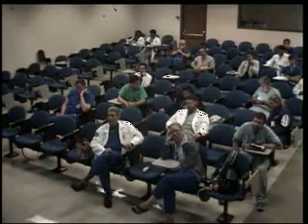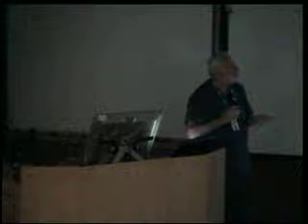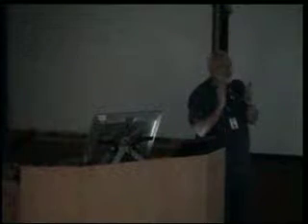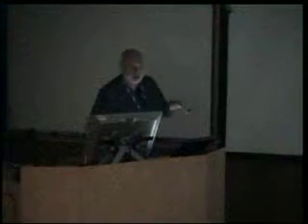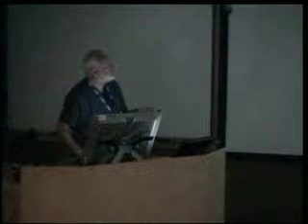Radiographically, of course we are going to wait for the endoscopy, but if you would like to guess if this is a recurrence or something post-surgical, the best way is to apply different degrees of distension. When this changes the shape, maybe it's post-surgical. If it remains exactly with the same shape, probably it's an area of scarring due to a tumor or recurrence of the tumor.